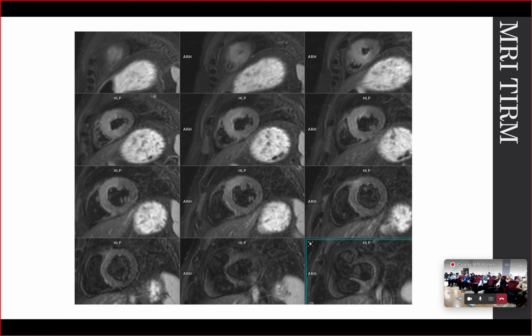And among the differential diagnosis was myocarditis. That's the reason why we have done the turbo inversion or the edema sequences. Could anyone see edema in these images?